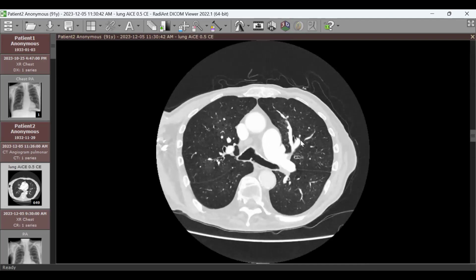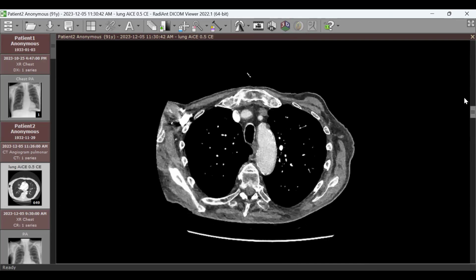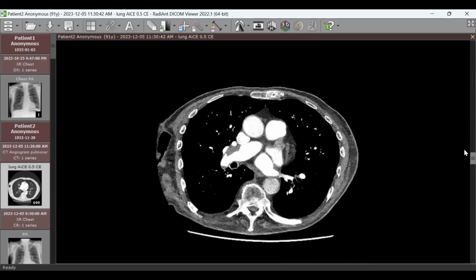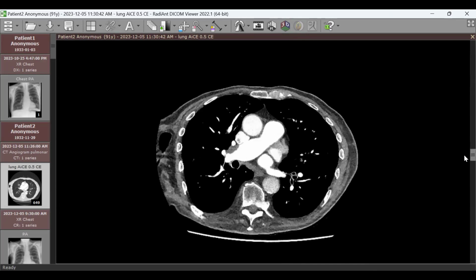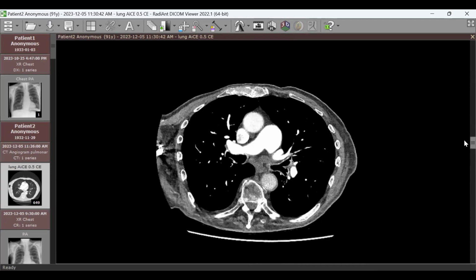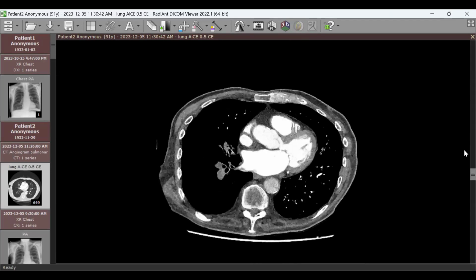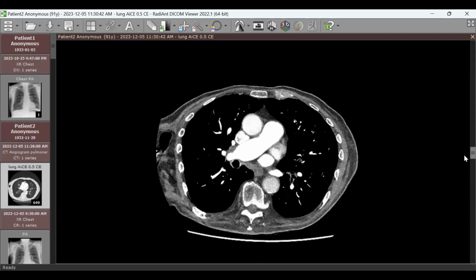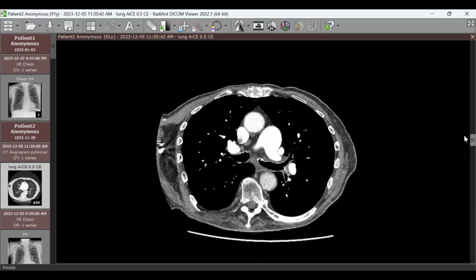See now, let's go to the CT. So first, as we agreed, technique, CTPA. What do you think of the opacification of the pulmonary trunk? We have to measure the density of the pulmonary trunk. Good. It's higher than the aorta, and it's clear. Just to confirm, yes, 560. That's very good. And there was diffuse emphysematous change.